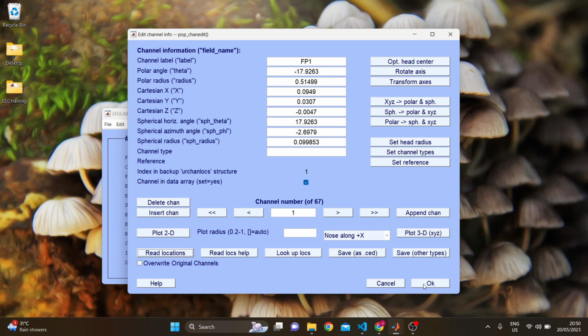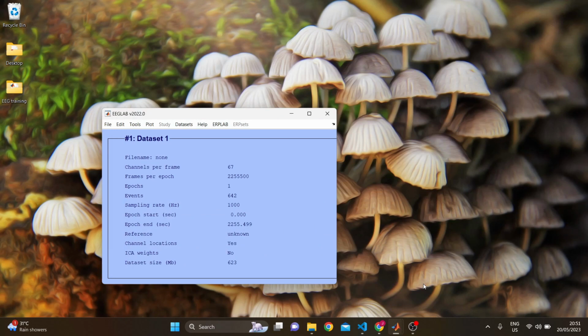However, for most people, as I said, this will be sufficient. If you press OK, you can see that now the channel locations are updated.